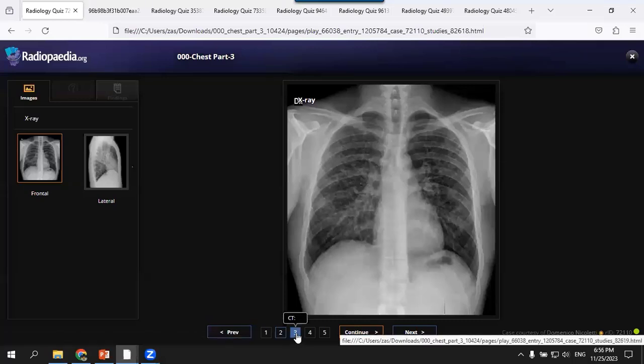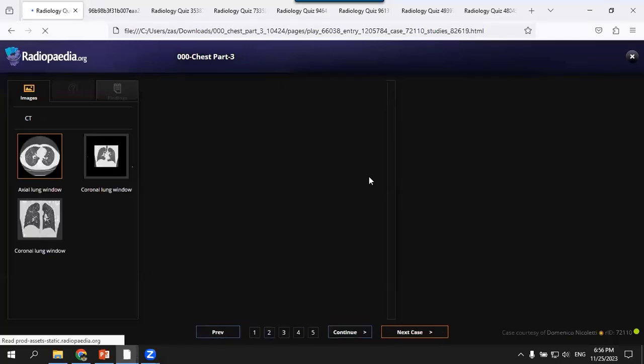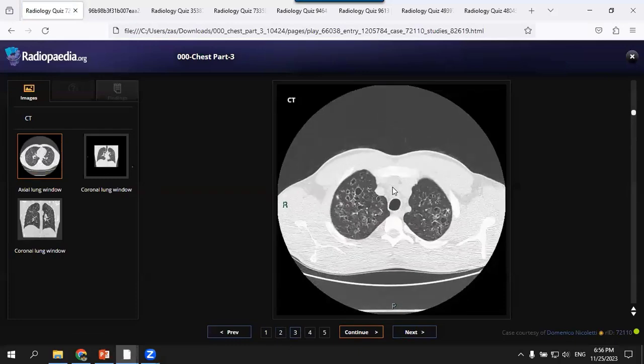What specific history do you want to ask? I would like to know if the patient is a smoker. Yes, this is on top of the list. What if female? If it is a female patient, I would think about lymphangioleiomyomatosis, and also ask about history of smoking. Langerhans in a smoker, male or female. Okay, CT scan.